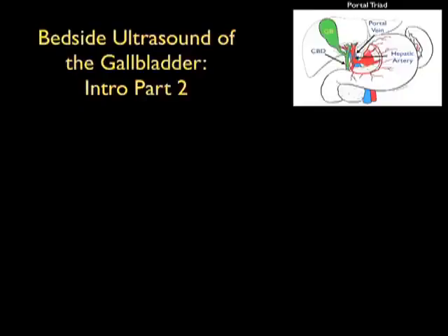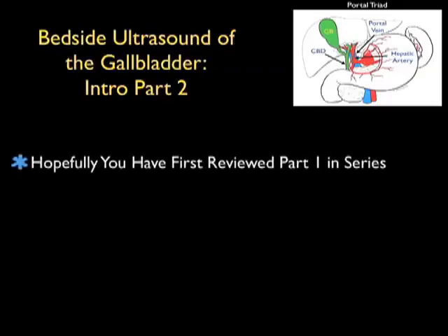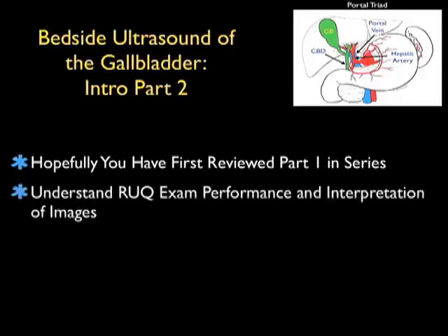In this Soundbites module, entitled Part 2 of Bedside Ultrasound of the Gallbladder, we're going to go further on to our discussion of gallbladder sonography. Hopefully, first of all, you've reviewed Part 1 in the series and have a basic understanding of how to perform the right upper quadrant exam, and also how to interpret the images that you will obtain.